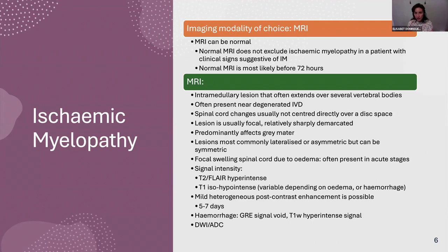We can do a myelogram, and we can also assess or see some changes that may suggest that we have a focal intramedullary lesion with attenuation of the contrast in the subarachnoid space. But again, seeing the proper lesion in the parenchyma is complex.